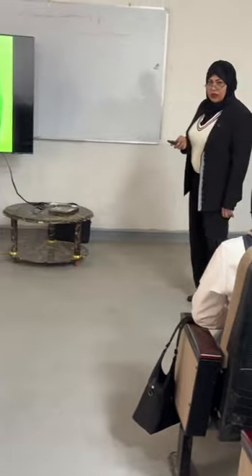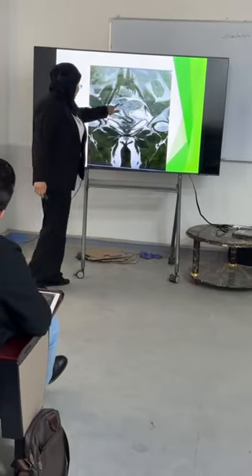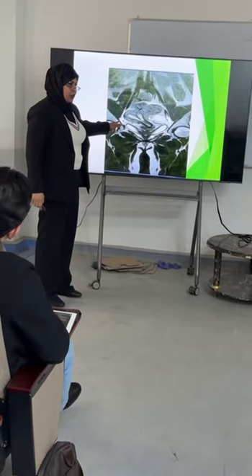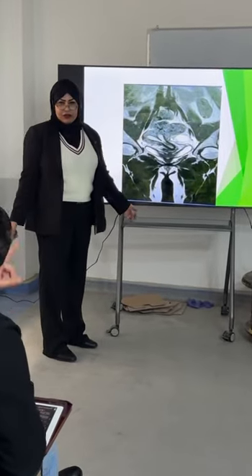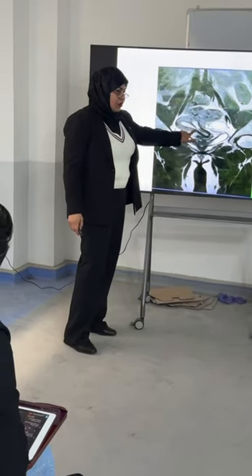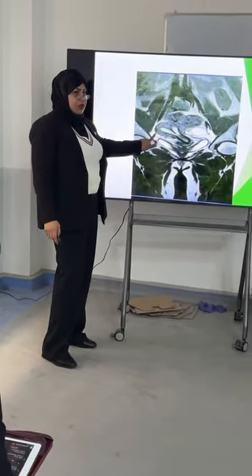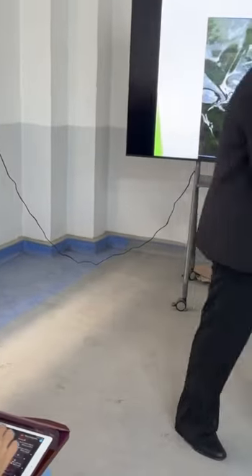Look for the dome. Is it preserved or not? The dome is preserved, and the septum is descending downward from the preserved dome. So it is a type of septated uterus.